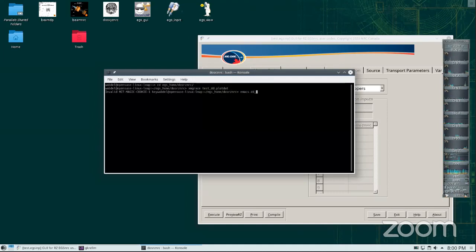Depth dose, test directory. I'm playing this on a monitor far from my eyes, so that's why I'm struggling to type things properly.